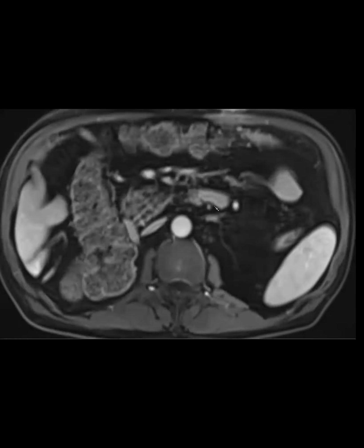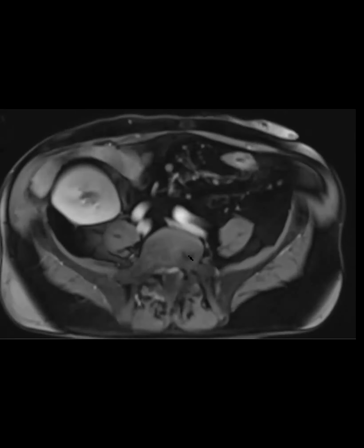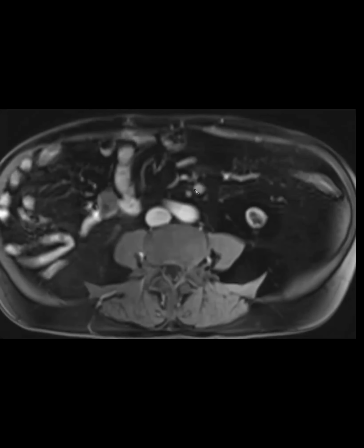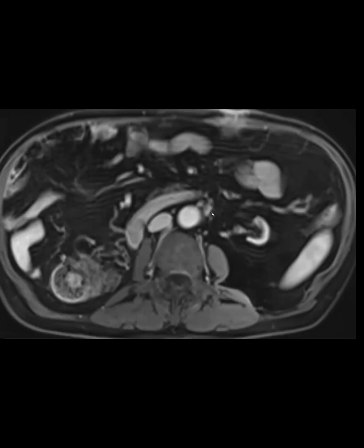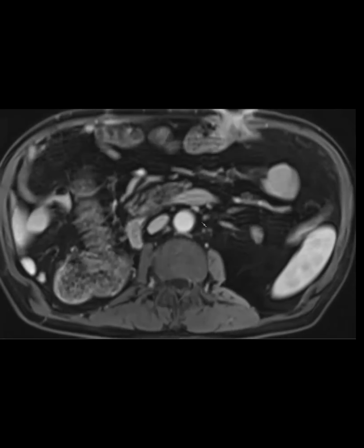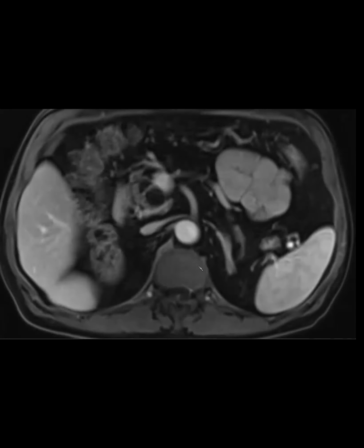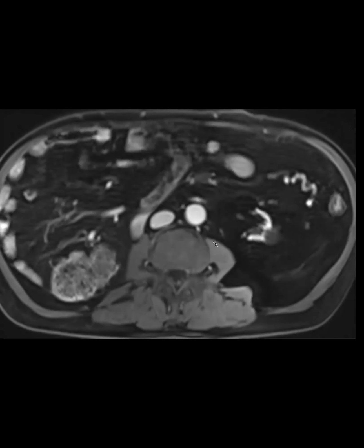And the point of my case is that we were looking at all these lymph nodes around it. And there's even a lymph node here. And there's a lymph node here. And so we called this a para-aortic lymph node. I guess the teaching point here is that you can see it's right next to the IMA. And so we should call this an IMA lymph node, because an IMA lymph node is still in the regional nodal distribution, whereas a para-aortic lymph node, truly above the IMA level in a para-aortic location, would be a distant node. So just be careful if you see a high node: if it's next to the IMA, it's still called an IMA node.